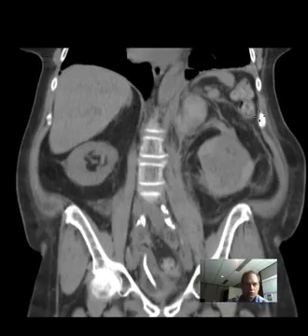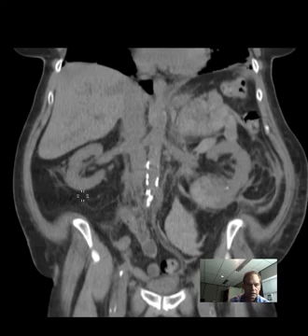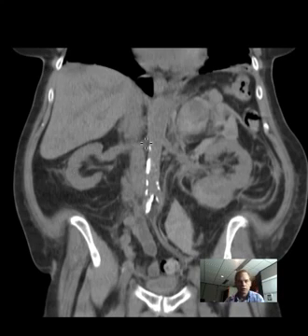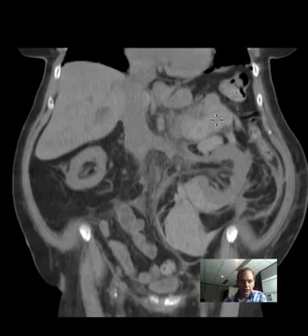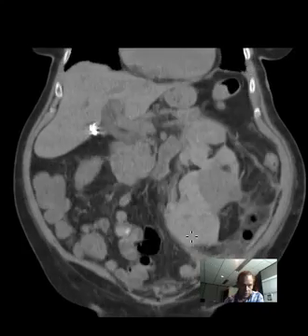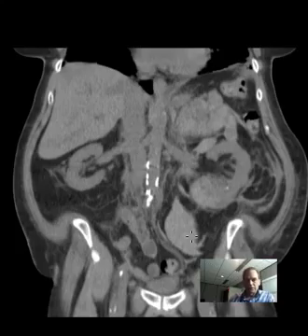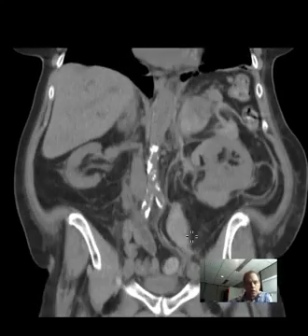This shows you that hematoma very nicely, again in the perirenal space, and look what it's done to the perirenal space. Even though it's a very small space, it varies from patient to patient, but even in this case you can see it's sitting here quietly. You'd never think there was much to that anatomy, but you blow up an adrenal gland like this and sure enough you get all this stranding and high attenuation and enlargement, and whoa, we got a big part of the hematoma down here too. So this is an unusually large, actively bleeding adrenal gland hemorrhage.